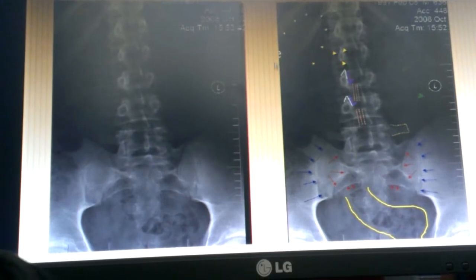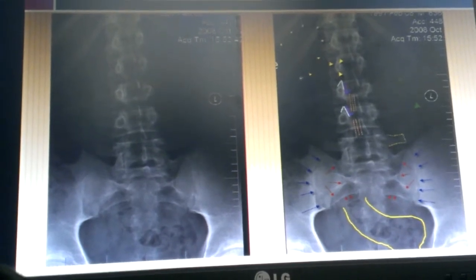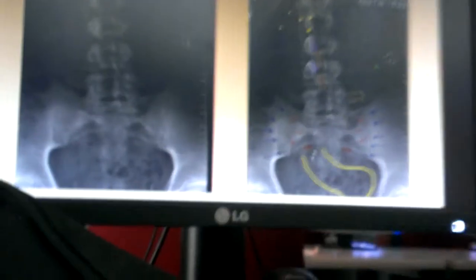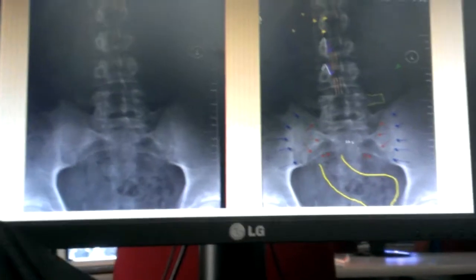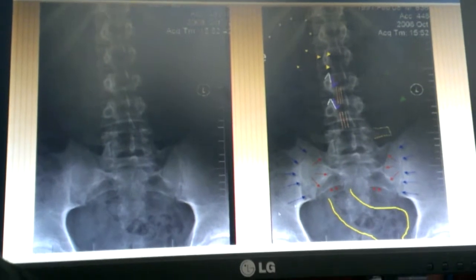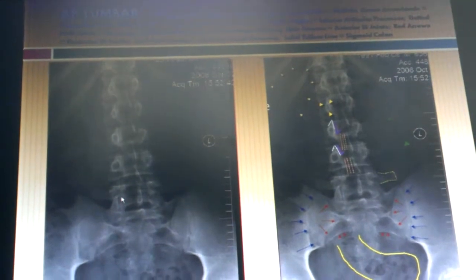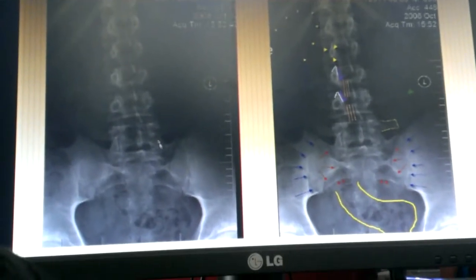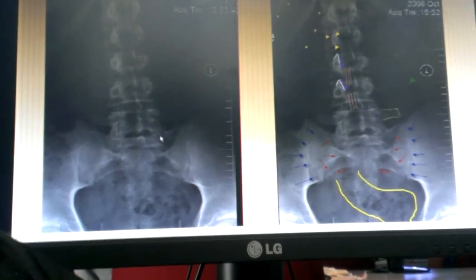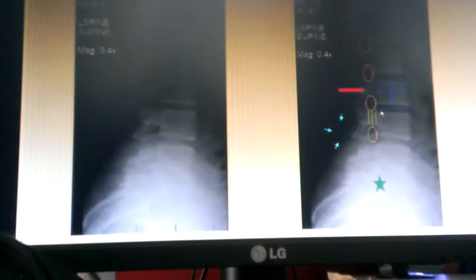this is what we're trying to do here. It's not so clear because you can't see it way over here. There's a kidney there. This is just sigmoid colon, not so S-shaped, but supposed to be kind of S-shaped. And then the rectum would be more vertically oriented. It kind of looks like you might have tropism here, right? Sagittal and coronal, but maybe it's just a little off, and there's a little bit of obliquity to it, because I'm thinking that maybe there's a lucent line there. Okay, let's look at that slide.